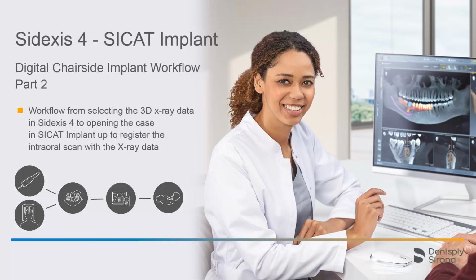Welcome to this video tutorial on the topic of Digital Chairside Implant Workflow. This video is part 2 of a tutorial series. In this video, we focus on the workflow from selecting the 3D X-ray data in Sidexis 4 to opening the case in SICAT Implant up to registering the intraoral scan with the X-ray data.